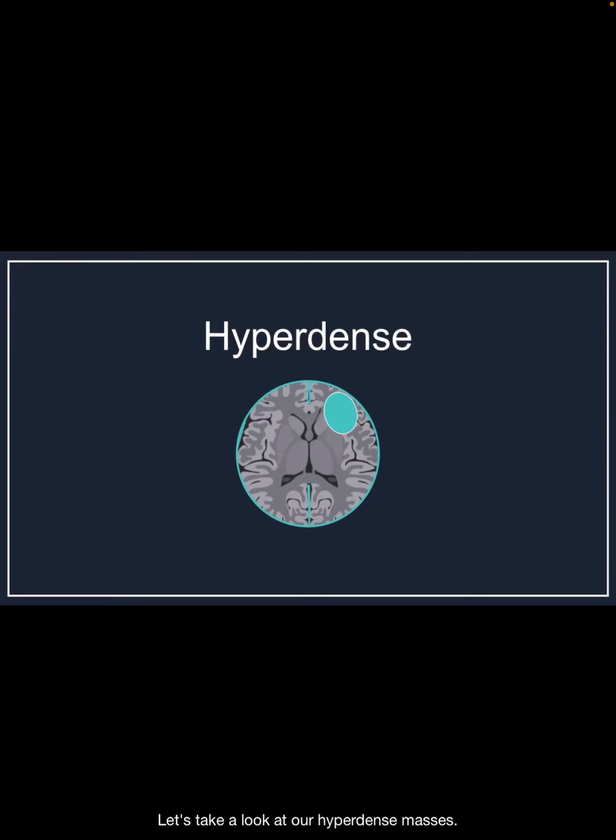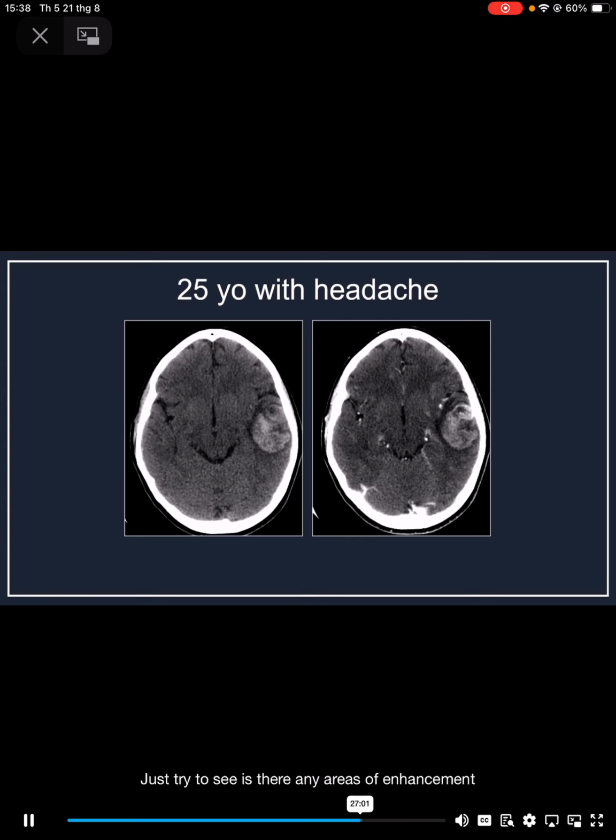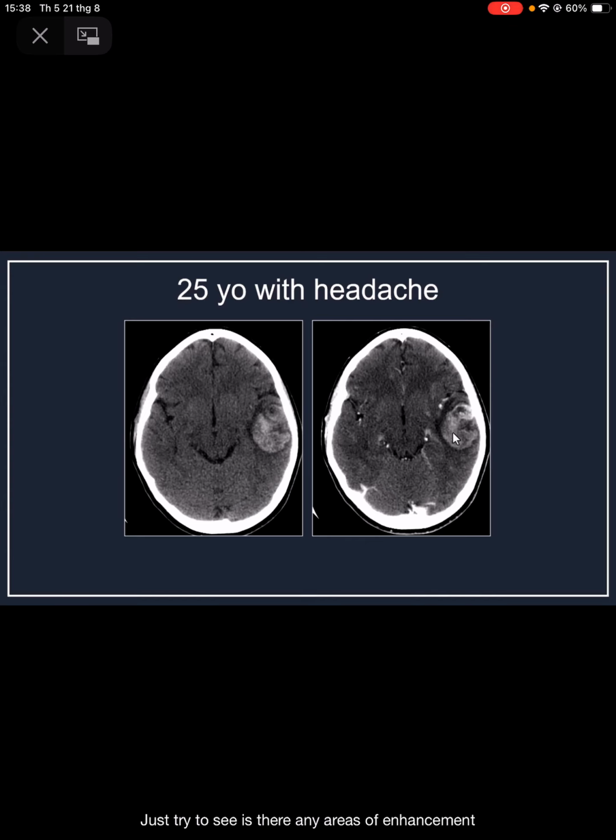Let's take a look at our hyperdense masses. Our first case in this category is a 25-year-old who's coming in with a headache. We can see that the patient has a hematoma within their anterior temporal lobe. The patient ends up getting a post-contrast CT as a part of their workup, just to see if there are any areas of enhancement, and maybe just a thin rim of enhancement around the periphery. But it's hard for us to know what the underlying cause of this hematoma is.